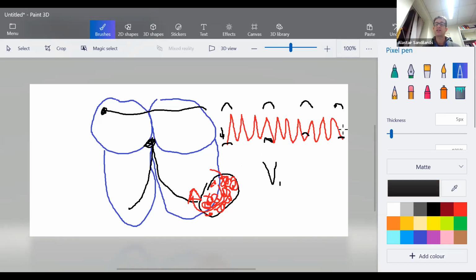So when you're looking in V1, the best ECG lead, you see this evidence of dissociation. So there's V's, lots of V's. You can't always see the P wave, but you're getting an idea of the P wave rate here by looking at these two signals, okay? And that will give you your sinus rate. And when you have that, that is pathognomonic of ventricular tachycardia.